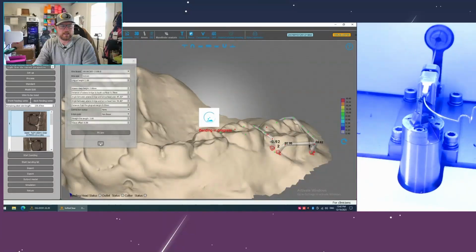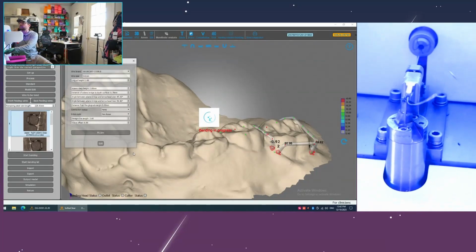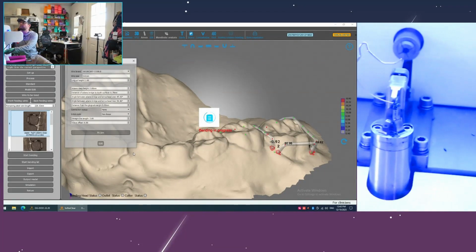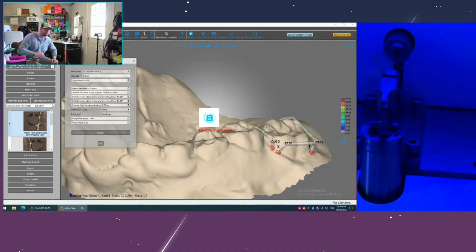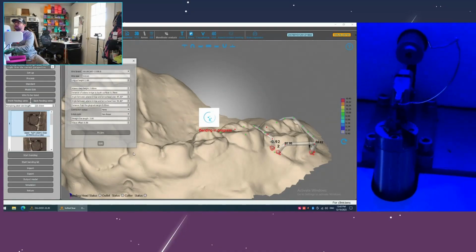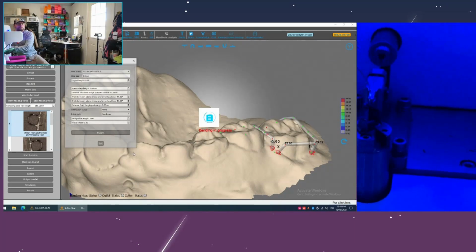Okay, I'm going to hit edit. I need to move my camera a bit, center it a little bit better. Nope, that was absolutely horrendous. Why did it suddenly do that? Sorry, guys.